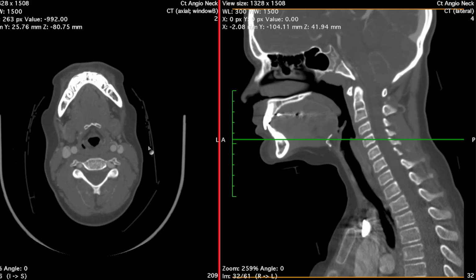You may recall from previous anatomy labs in your MSK modules that the cervical vertebrae have some unique characteristics. And one of those is that the transverse processes have foramina themselves. These foramina are called transverse foramen. And within the transverse foramen, it's important to know that there are blood vessels traversing here. So you can see this hyperdense bone with this less dense vessel here. This is the vertebral artery. And vertebral arteries are very important blood supplies from your heart to your brain.